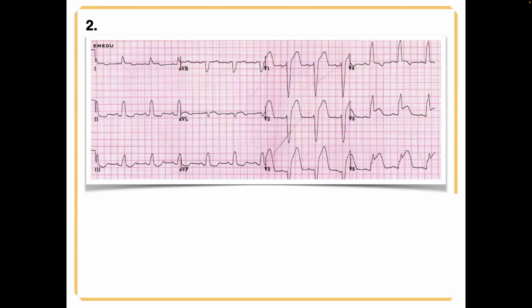Okay, so Cody, you want to go next, please? Okay, so we're going to start with Sgarbossa B, which we're looking for downy in V1, V2, or V3. And I don't see any. They're all downeys with uppies, right? Yep. So next we'll go to Sgarbossa A, which is in any lead, an uppy.